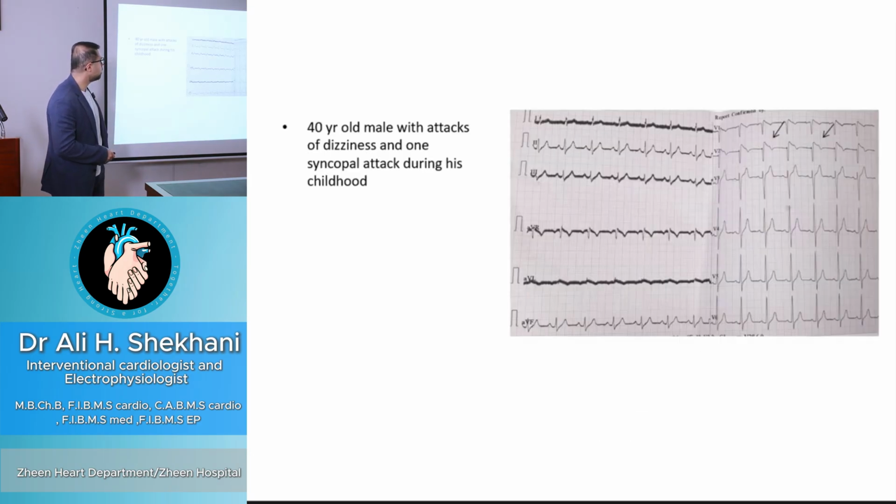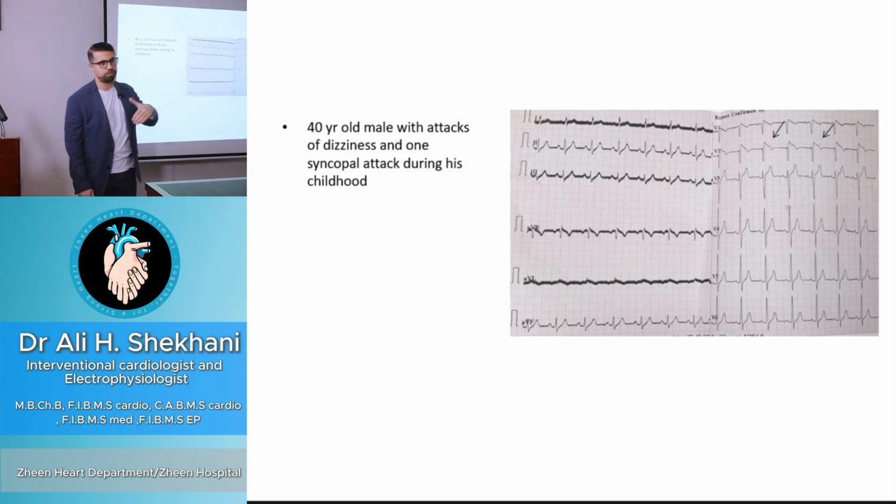And this is another patient, 40 years old, with attacks of dizziness and syncopal attack. It is the classical ECG finding of Brugada syndrome. ST elevation is just in V1, V2, and it is coved-shaped. So this is a Brugada.